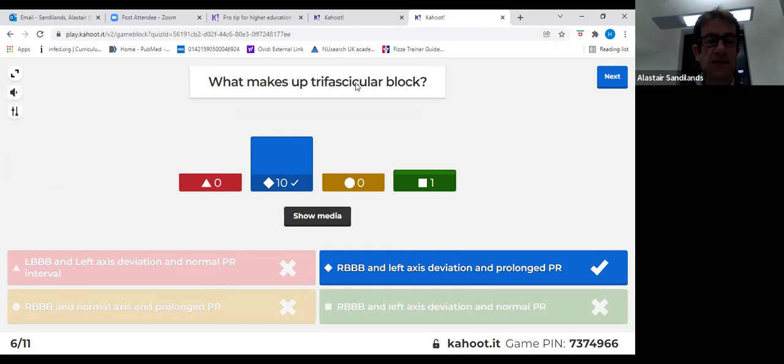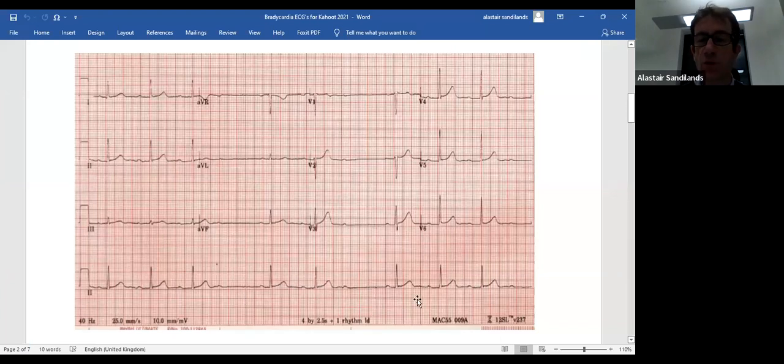Apologies, just going back to this ECG for those that want the answer. If we walk and talk through this, we have an irregular rhythm. It's a bradycardia, intermittently bradycardic, with a QRS that's narrow. Do we have any P waves? Yes. What is the relationship of the P waves to the QRS? Well, there's this prolongation. So it's prolonged, gets more prolonged, and then the P wave doesn't conduct through the AV node.